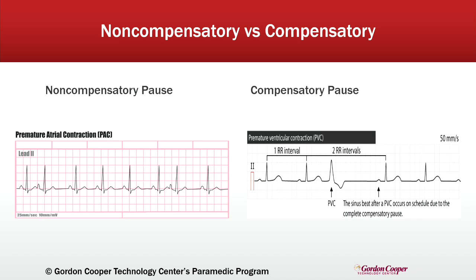Now, I just put this together because there are questions many times about non-compensatory versus compensatory. This is not in your text. But when we say non-compensatory, what is that? That non-compensatory pause happens after an early or extra beat, but the heart doesn't really catch up.